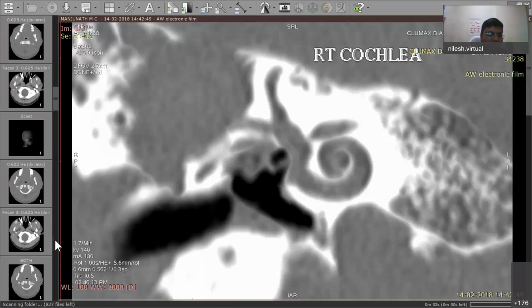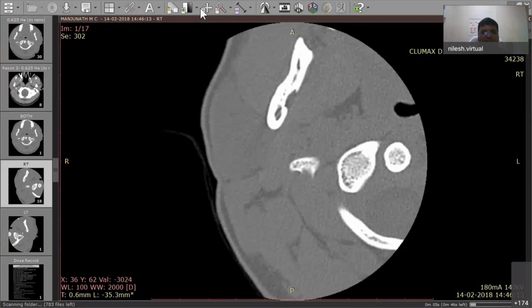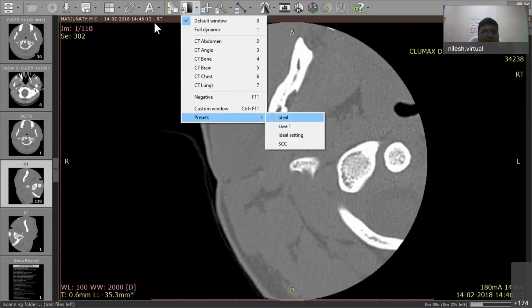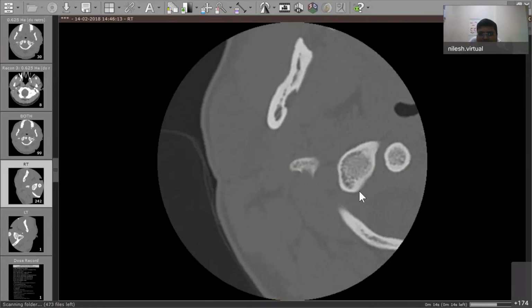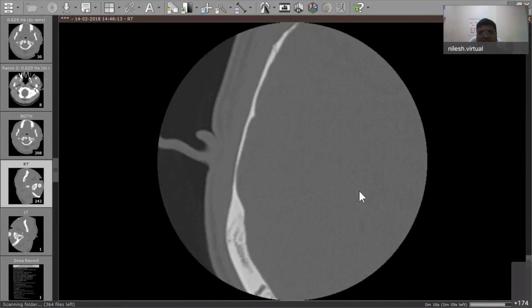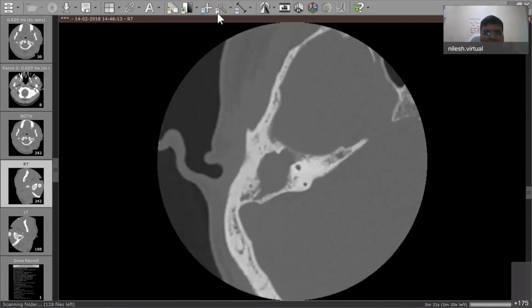So we'll see the lateral semicircular canal. Yesterday we already saw how the lateral semicircular canal looks. So now we'll try to find out what is happening here with the lateral semicircular canal. Again, you go in the top, as semicircular canals are easy to identify from top to bottom.